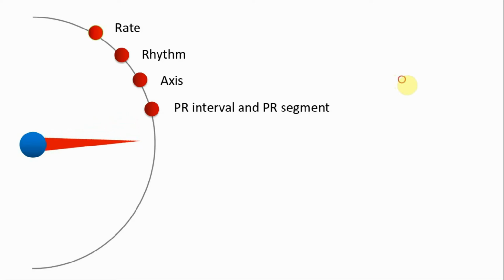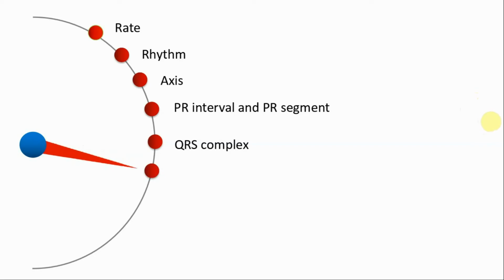Sometimes we say that there is a gold mine in the QRS complex, and that is true for Mobitz type 1 and Mobitz type 2 heart block as well. Conventionally, in Mobitz type 1, the QRS complex is narrow, as we mentioned earlier, because the block is at the level of the AV node. Because Mobitz type 2 has the block down below the AV node, the QRS complex is usually wide, but not all the time. So that will give you some rough idea, but it is not confirmatory and it is not definitive in 100% of the cases.